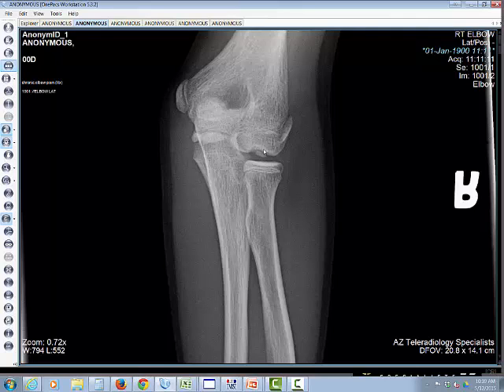Now look at the capitellum here. We talked before about the capitellum should always be one large single ossification center. Unlike the trochlea, which can have little areas of fragmentation and multicentric, capitellum should not. So when we see this extra piece of bone here, this is definitely going to be an abnormality, and this is an osteochondritis dissecans of the capitellum. It's analogous to the osteochondral lesion that we saw in the ankle along the talar dome. These can be loose and unstable fragments. It can be a debilitating injury. So very important to recognize or look for any irregularity or lucency along this capitellum.